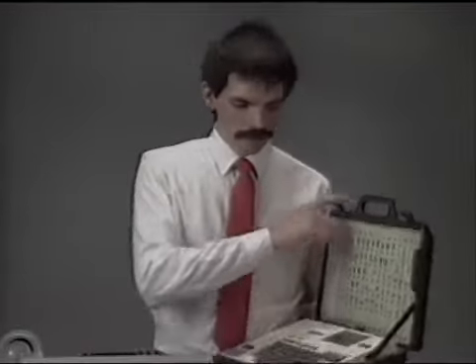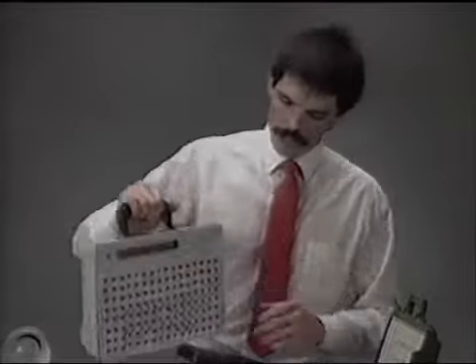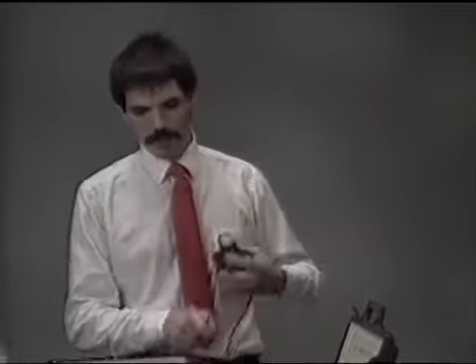Now, it's nice to have the spoken output. It's also desirable to have the male and female output. Now, this device uses a slightly different voice, and I can operate this particular one 25 different ways. I have it set up right now to operate with a joystick.